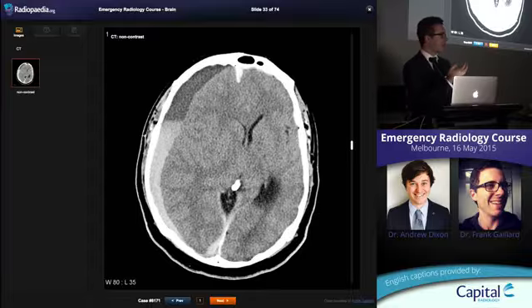And the blood is heavier than just serum and sinks to the bottom. The one caveat with that is that if your blood is anticoagulated, it will also do this. And you know this because when we send off FBEs, we do that in a heparin tube where we deliberately stop the blood from coagulating. And if you let that settle, it'll settle into a hematocrit. And so that might be what you see if the patient's on warfarin.